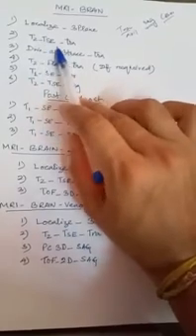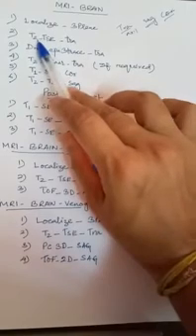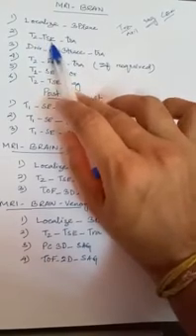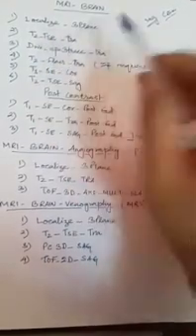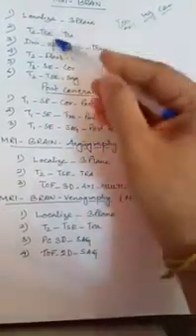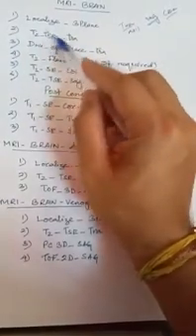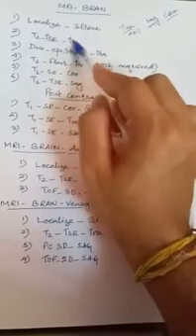T2 axial. Trans means axial. There we have written T2 TSE. TSE means turbo spin echo. Sometimes we can see that the T will be omitted. So remember one thing, SE means spin echo. So we have to use the spin echo T2 sequence for axial.